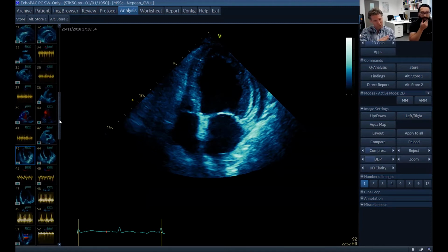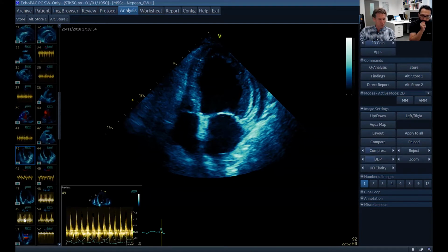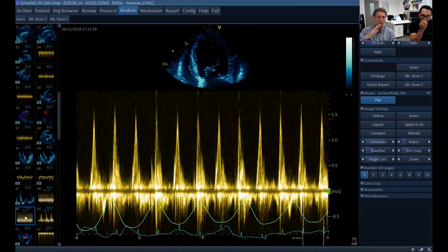Nice. Okay, so we talked about the clinical signs. We talked about the 2D features with particularly the RV and the RA free wall collapse. Let's move on to talk a little bit about Doppler. I'm afraid I've only got one of these images, but we talk about a change in flow variation across the mitral valve and across the tricuspid valve. I've read different reports in different guidelines saying what it is. I use about 45% for the tricuspid valve and about 25% for the mitral valve. What do you use? So look, I think I'm there with the same numbers. I generally use 40%. I've read as high as up to 60%, but I tend to use the 40% cutoff for the tricuspid. So 40, 45, I think we're being arbitrary. The mitral valve, I use 25%.